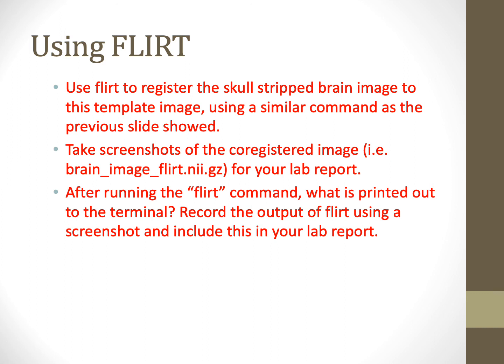After running FLIRT, what is printed out to the terminal? Record the output of FLIRT using a screenshot and include this in your lab report.